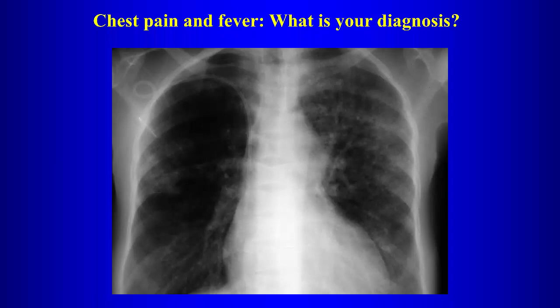But there's another finding on the chest radiograph. And it's important to be able to notice these things because often the ER is very remiss about giving you the history. So you might wonder about lymphadenopathy here, right? There's this extra bump, right? So that certainly might be lymphadenopathy.